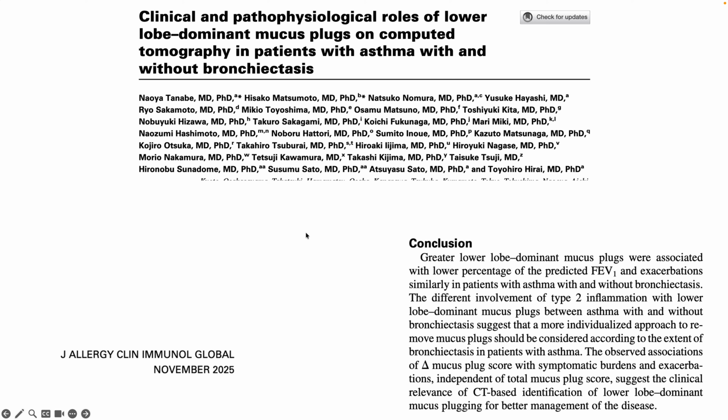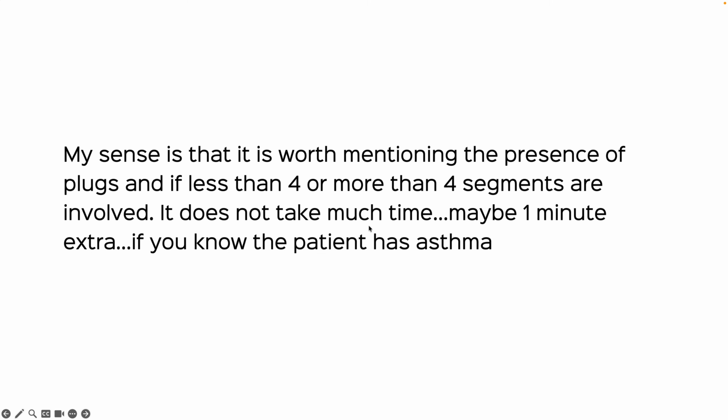But then this paper, supposed to be published in November 25, but I think it went online in August, says that if you have lower lobe dominant mucus plugs, these people have lower FEV1 and increased exacerbations, and clearly this is relevant. So I don't know.